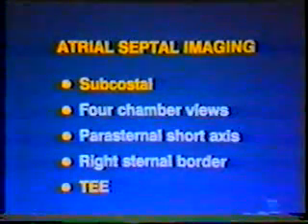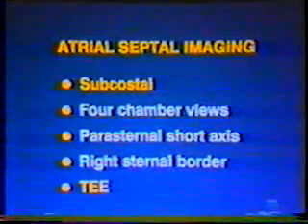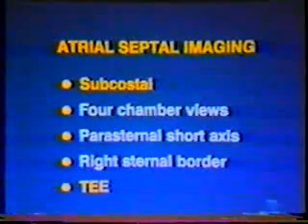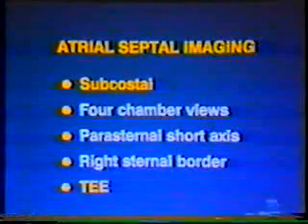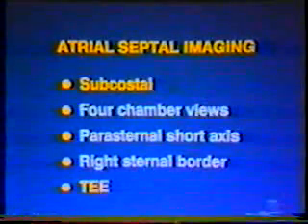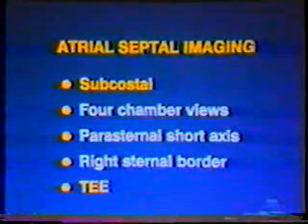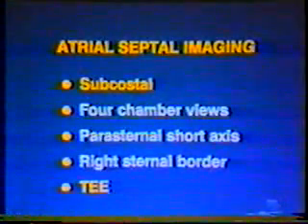from many different ultrasound windows as are listed here. The subcostal window is particularly important since from this approach the ultrasound beam can be directed nearly perpendicular to the atrial septum, and hence the defect can be confidently visualized. False positive dropout in the region of the fossa ovalis is a frequent problem when the atrial septum is imaged from the apical or paraapical positions, as well as in the parasternal short axis view.